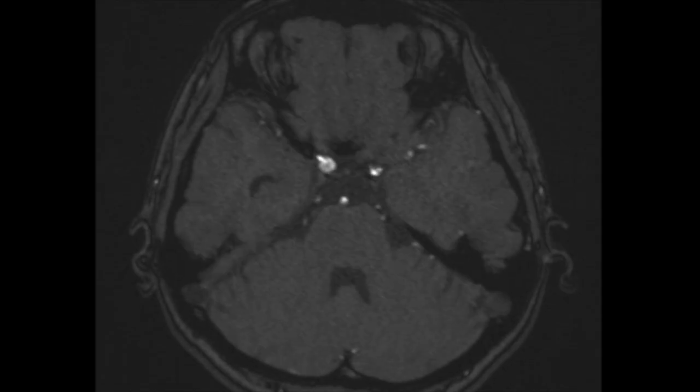Treatment options generally include endovascular coil embolization, in which a catheter is used to fill the aneurysm with coils to block blood flow, or surgical clipping, in which the skull is opened and a clip is placed directly on the aneurysm to occlude it. Because each case differs, patients must consult a specialized medical center. How is that? This is how we interpret MRI images in cerebral aneurysm cases.